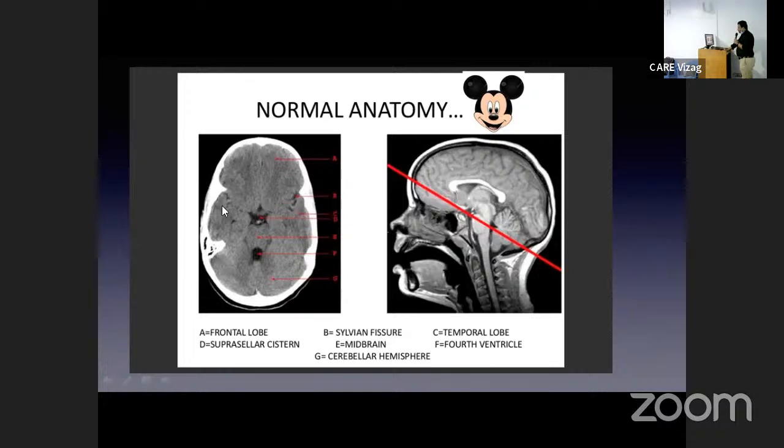And this is the entire frontal lobe. Previously, we were seeing the basifrontal lobe. Now we have the frontal lobe cortex here. And this is at the level of the superior temporal gyrus, and this is at the level of the inferior frontal gyrus. And medially, you'll be able to see the cingulate gyrus here coming into this section.